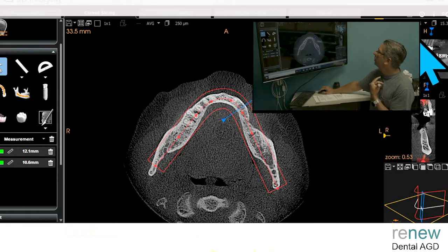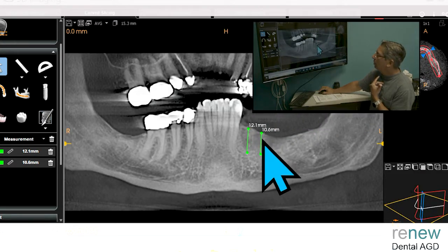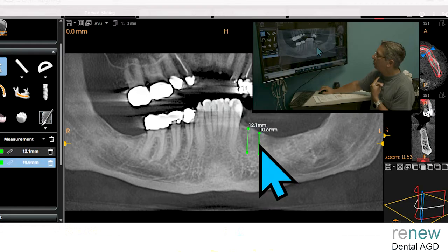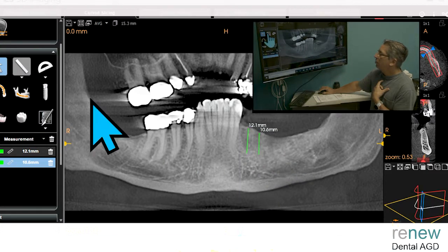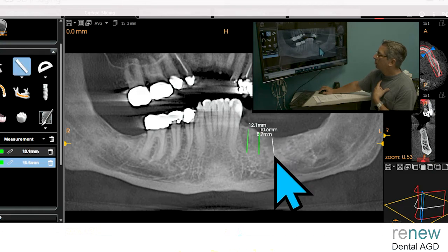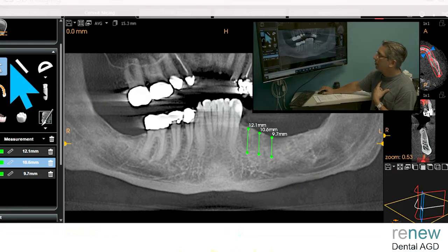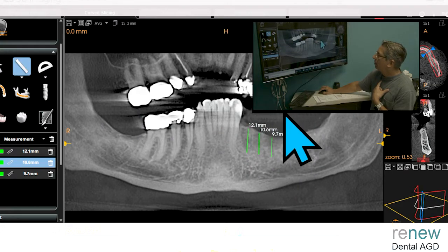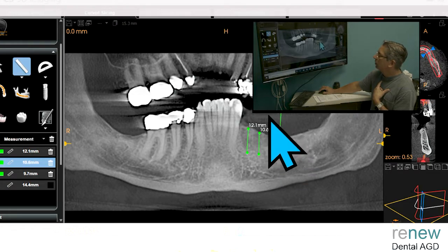I already pointed it out here, but you're going to be putting crowns on, so you're probably at the premolar. You want to stay away from this root because that root was right on top of that root. Then your third tooth is going to be somewhere right about here. So you're looking at possibly 1, 2, 3, and then your crowns are going to come out to about here. Okay, so your occlusion is going to be through here, and your implants, let's say, would be here.